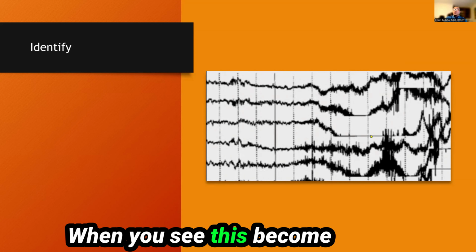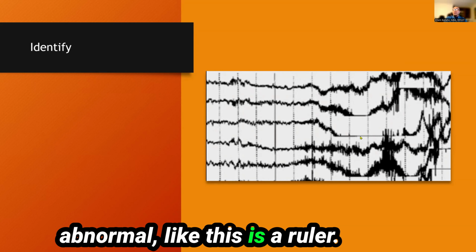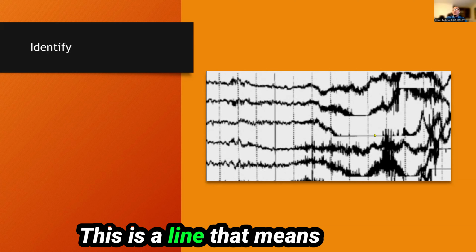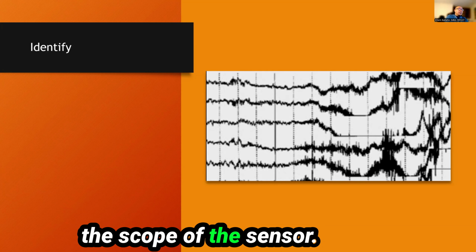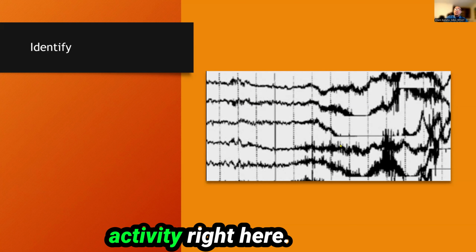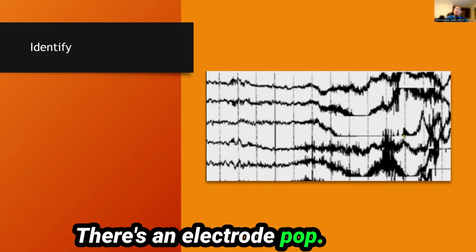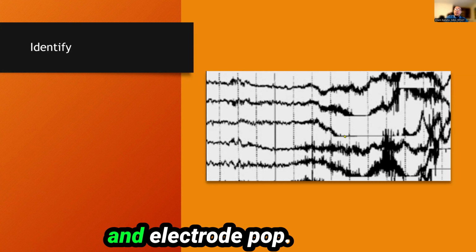When you see this become flat like this, like this is a ruler, this is a line, that means the artifact went beyond the scope of the sensor. It becomes flat, okay? But this is a lot of muscle activity right here. There's an electrode pop. This is electrode pop. And so there's movement, there's muscle here and electrode pop.